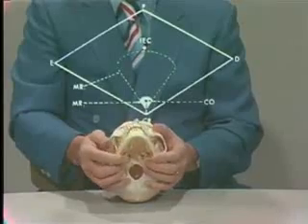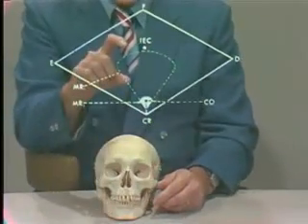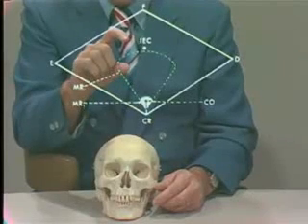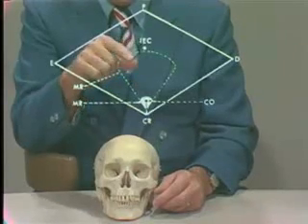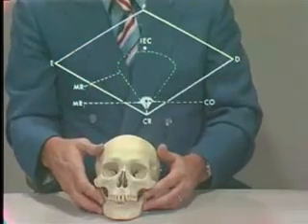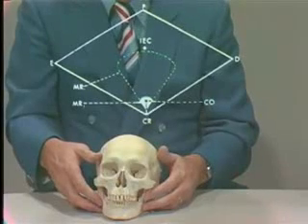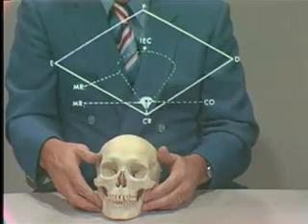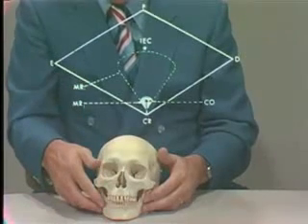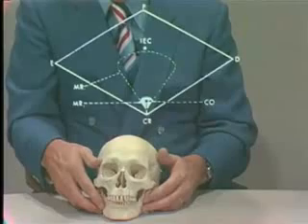Now if you notice the CR to CO on your screen, this is an exaggerated demonstration of that movement because the distance is not nearly that far. If you note the dotted portion within this diamond-shaped diagram, this is probably the envelope of motion that we might use, and the very dark area nearest the CR to CO is probably the chewing area that we would use.